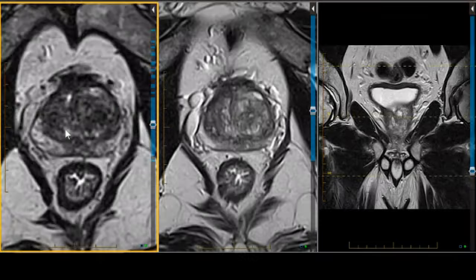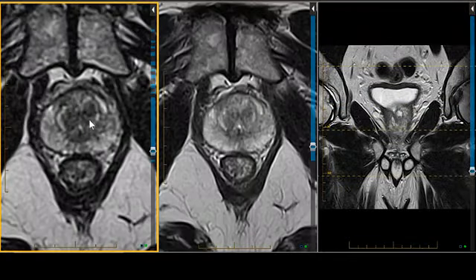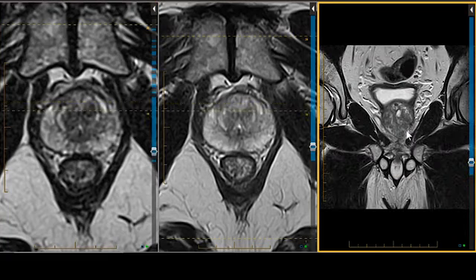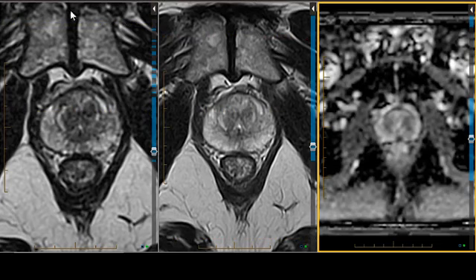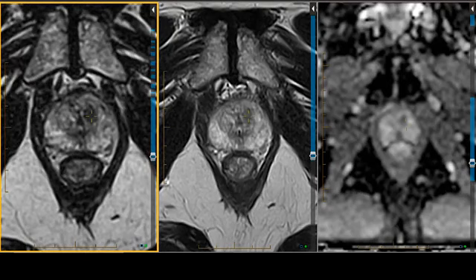And the apical nodule area, let's go down there, down to the nodule, down low. Here it is. And pretty hard to see in the coronal, admittedly. Let's look at the ADC map. I think mapping with the axial is probably our easiest bet. Let's go to our lower lesion here. There is diffusion restriction. Not that helpful, but a supplementary finding.